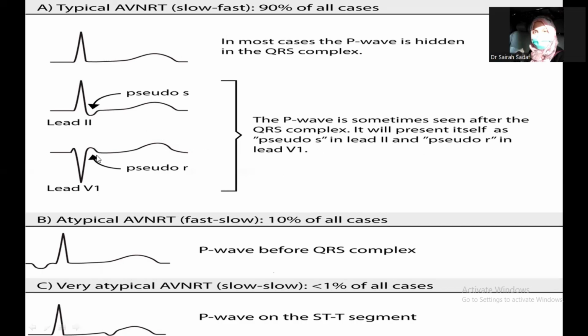As you can see here, this is a very self-explanatory ECG tracing. If you want to take a picture, take a picture. If you want to take a screenshot, take a screenshot. And let that sink in.